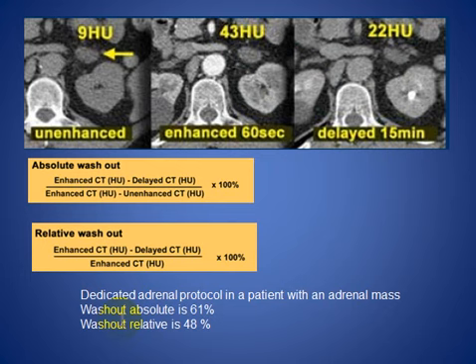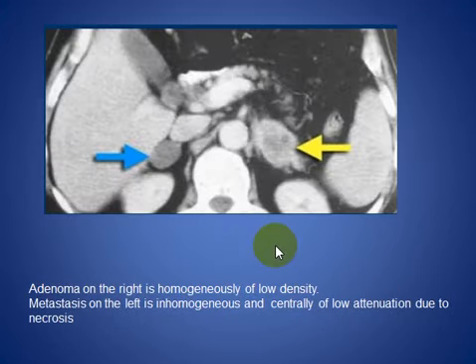The absolute washout is 61%, so this is an adenoma. And the relative washout is 48%, which is also consistent with adenoma.